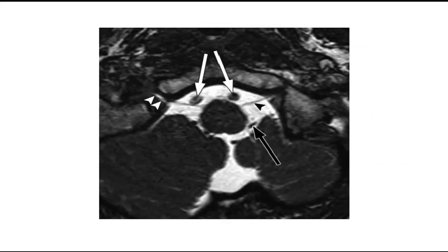This is an axial section, 0.8 mm thick, SSFP-MR image. We are able to see the cerebellum here, and this is our hypoglossal nerve going into the hypoglossal canal, and these are the two vertebral arteries, and behind them is the PICA. This relation of the arteries and the nerves is very important here, because the vertebral arteries are in very close proximity to this hypoglossal nerve.